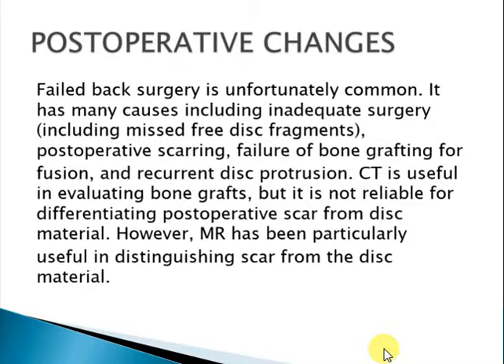So CT is useful in the evaluation of bone grafts, whether they are fused or not, but it is not reliable for differentiating scar from disc material. MRI is very helpful in this case.